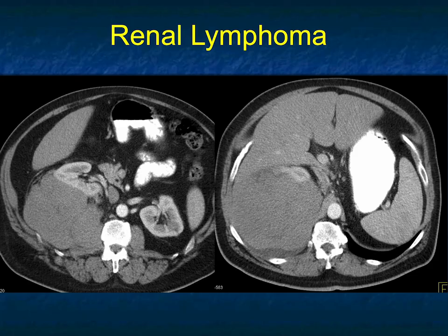This is a great example of renal lymphoma with involvement of the peri and pararenal space. Excellent example of the infiltration, displacement of the kidney, and interestingly, it's unilateral. Again, renal lymphoma typically is bilateral, and solid or multiple masses are more common, but this is not an uncommon appearance. Again, I mentioned metastasis like melanoma would be a thought, lung cancer would be a consideration, but I've never seen it with such large masses.